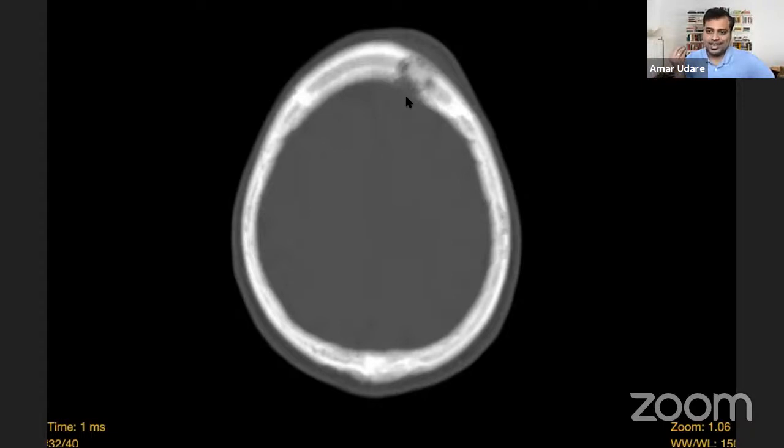Hemangioma is a good thought, but I have not seen hemangiomas cause this much destruction. The ones that I have seen are small and restricted. They are confined to the bone. This patient has a destructive lesion with soft tissue, so hemangioma would be lower down. Someone has said Langerhans cell histiocytosis, and that's what this was. When there is isolated skull involvement, what is the preferred terminology for this? Excellent. So all of you have got this one.